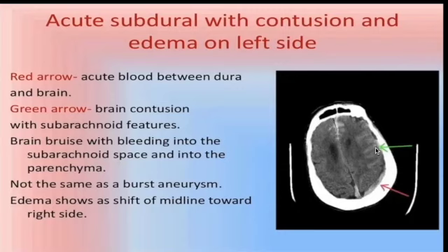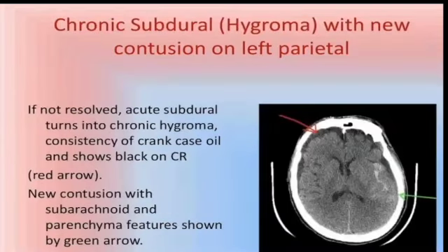So you can see here the white lines are signifying the subarachnoid hemorrhage. Now, the increased darkness around them, that's the edema that's surrounding it, and that's what's causing the midline shift that we're seeing around here. Okay, now let's go to the following image.